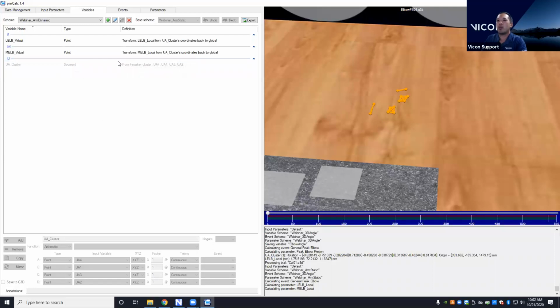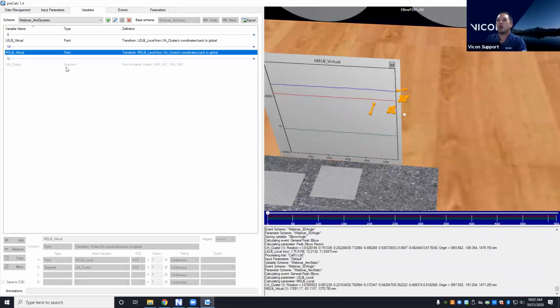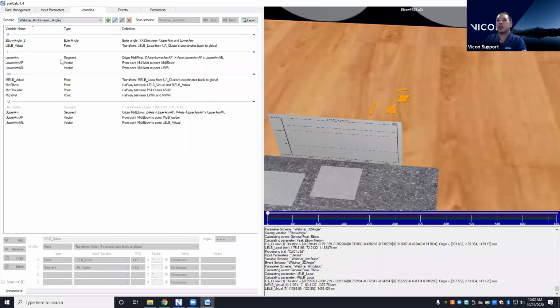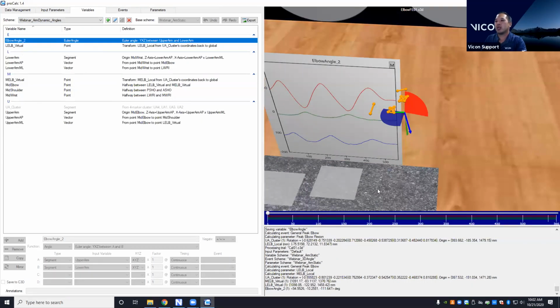And you could have a much more extensive scheme here that you don't want to recreate every single element within. So I've used that arm static base scheme. And then I've recreated that medial elbow and then that lateral elbow marker, right? And you can see that you get that preview as well. I can take this one step further, and I can recreate those angles that you saw within that first example with the 3D angles. And again, you can see how that would be output as well.